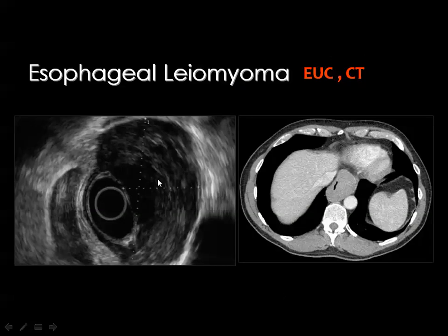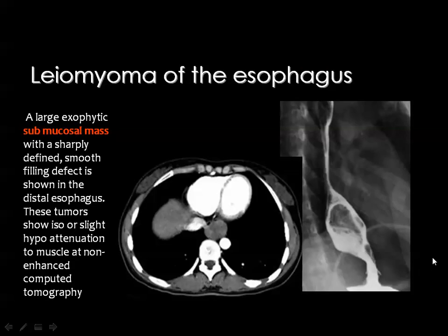activity. By endoscopic ultrasound and by CT, one of the helpful diagnostic criteria is to see the tumor in the wall of the esophagus with a compressed eccentric esophageal lumen, sometimes containing air or maybe some of the orally administered contrast material. If you look at the esophagus from one side, you can see expansion of the lumen, while if you look on the opposite side, then you see reduction of the lumen with exophytic extension of the tumor. But by CT, one of the characteristic criteria of leiomyoma is the compression of the esophageal lumen at the edge of the tumor.